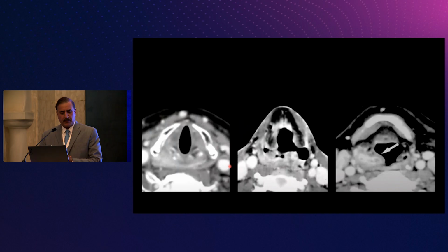So these are 3 different patients, and if I ask you what you think of these 3 patients, you might probably say there looks like a mass right at the cricoarytenoid junction. This is probably an apical piriform sinus apex cancer. This looks like a post-radiation change. There is diffuse change, some mucosal edema, and this, again, looks like a big blob mass. Of course, it's going to be squamous cell carcinoma that primarily involves the piriform sinus.